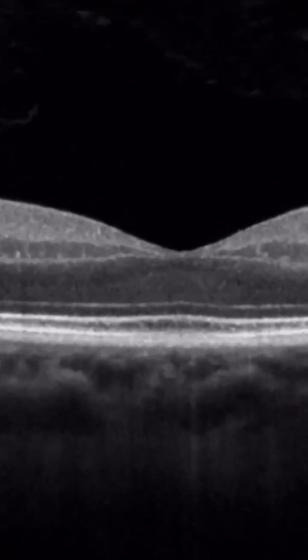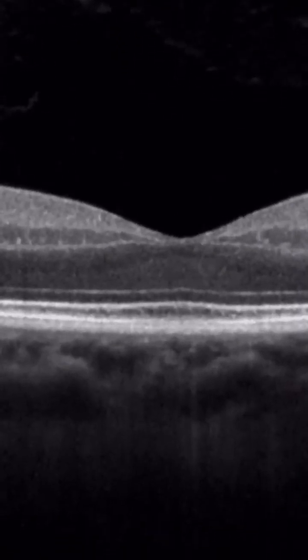I like to look at the OCT starting from the inner retina, from the vitreous and RNFL, and then progressively going deeper into the outer retina. So the first thing I look at is the vitreous and the interaction between the vitreous and the retina. You can see here the vitreous is attached to the macula. You can see the edges or the interface between the retina and the vitreous. However, if you go to the side, you can see that there is a separation between the vitreous and the retina. So here it's attached centrally and it's separated at the edges.